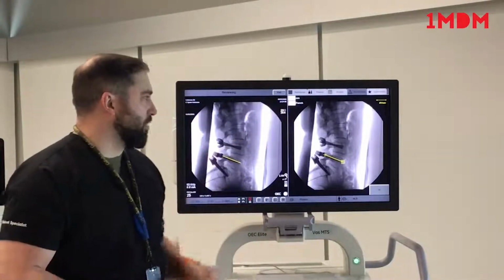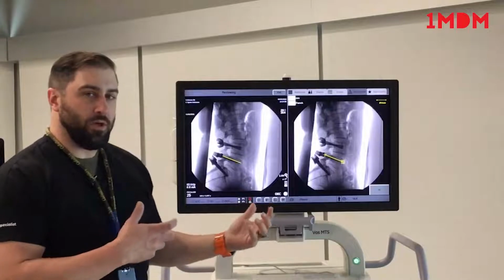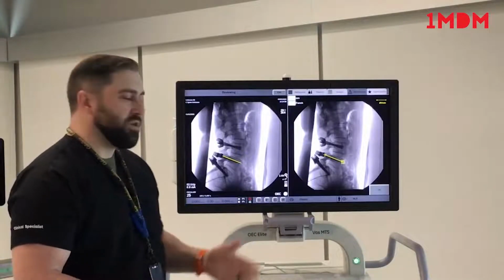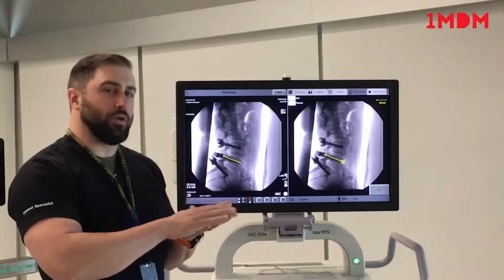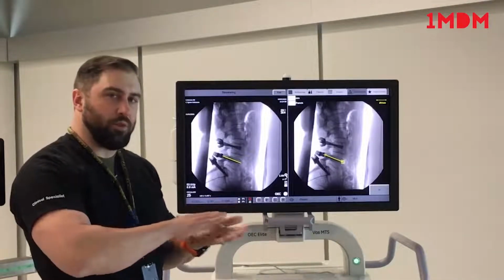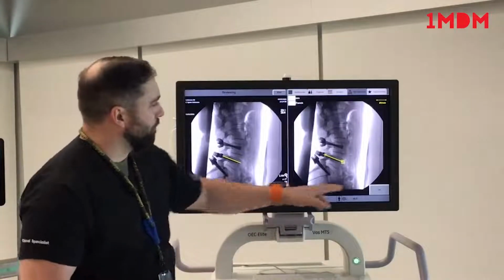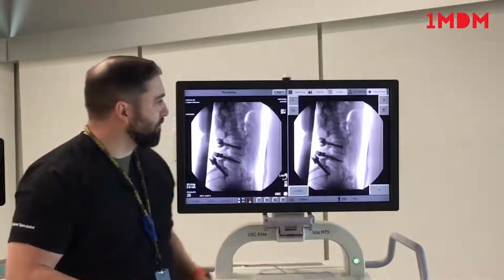I can also measure off of a French scale. So if we're measuring or calibrating the system from a catheter that's in place, we can do that as well. Just make sure that the anatomy and the thing that you're calibrating with are in the same plane, in the same line there, so your measurements will be as accurate as possible. Once I'm done with that, I hit OK.